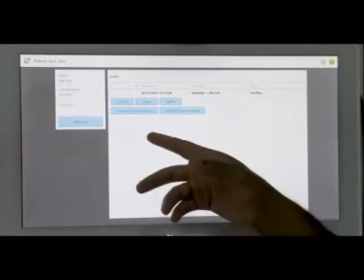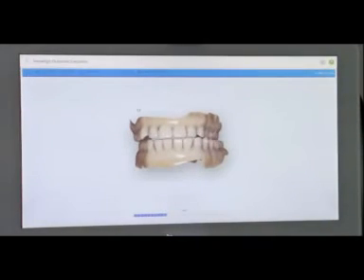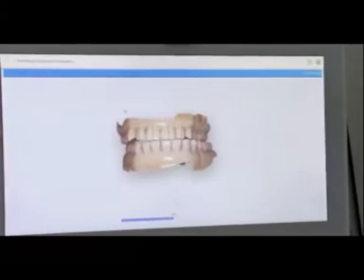Okay, so the other important one here is probably outcome simulator. This is really good if you're just scanning patients. As a base, I would say the best recommendation is that every person who walks into your practice gets scanned. And then you can have a record as well as be able to show them how their teeth will look straightened as well.